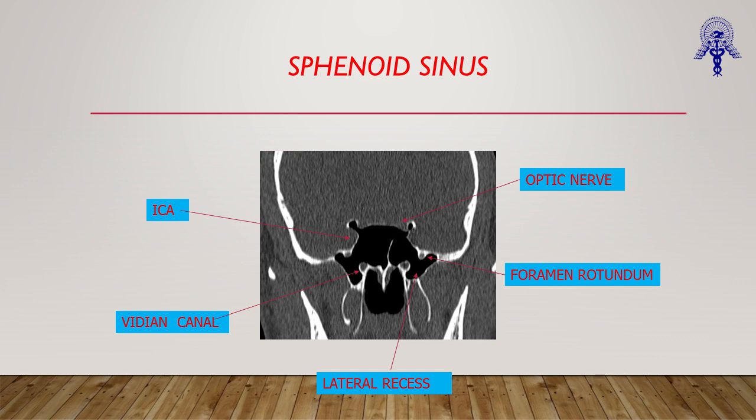So that is why your entire surgery success can be falling apart if you leave disease here. Disease means fungal debris. Polyp is not a major disease. Polyp will be resolved when you do intranasal steroid and douche and all. But if you leave fungal debris, and this is one area, just like sinus tympani cholesteatoma remains, here the fungal debris remains, which can lead to an early recurrence. So it is very important to understand whether the lateral recess is present.